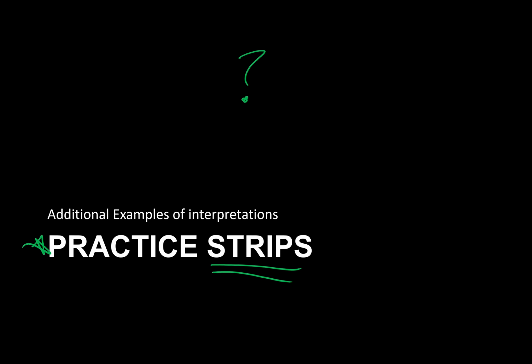These aren't necessary in order to complete basic arrhythmia or advanced arrhythmia, but it does give you the opportunity to maybe look a little bit deeper or find some additional guidance on strips that maybe give you trouble. Flutter is a good one, how to count the P waves and the conduction ratios with that. Or third degrees. I know I've got a little bit of extra there and some pacemakers. So just feel free, go through this section on your own if you want to.